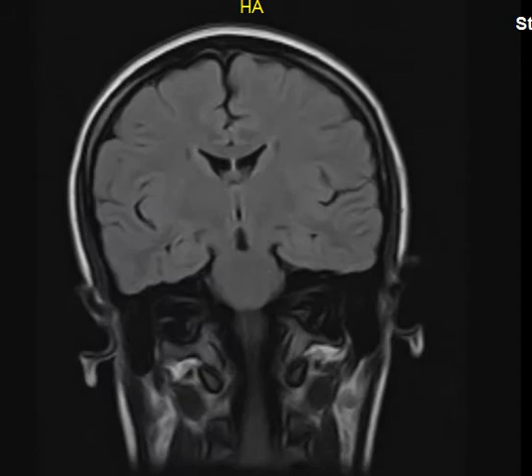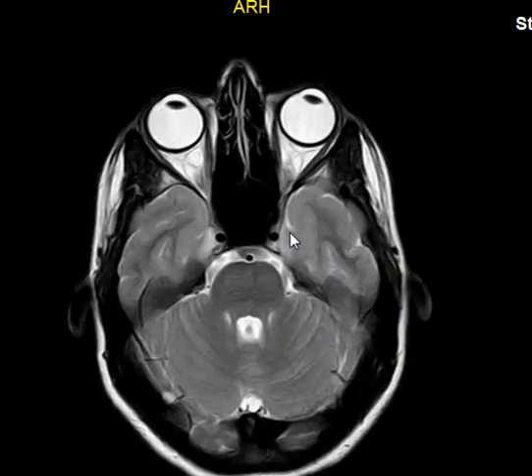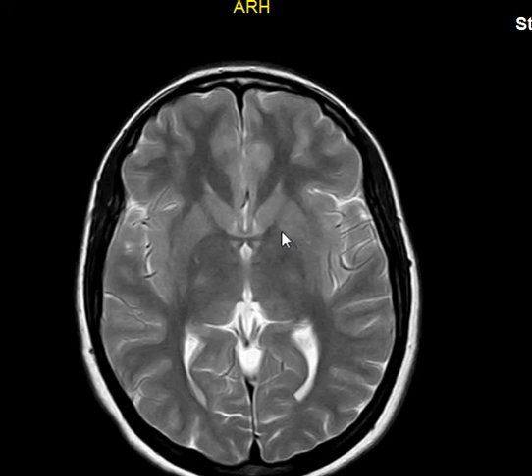After that, we will go a little bit down looking for the dural anatomy. We have three layers: the dura mater, the arachnoid mater, and the pia mater. The arachnoid and pia mater are usually invisible in a normal state. We don't see them in imaging anatomy. We are looking only for the dura mater in a normal brain. If there is abnormality, this is a whole new topic. We will not talk about it.